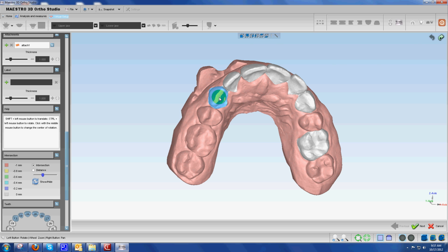So the moving of the tooth immediately adjacent to a non-defined tooth causes this distortion and warping of the anatomy that is very relevant. I'm going to undo all of those changes. And once again, going to the teeth that are protected by an extra defined tooth as a firewall, those changes do not affect the bicuspid at all. So that's an important consideration.